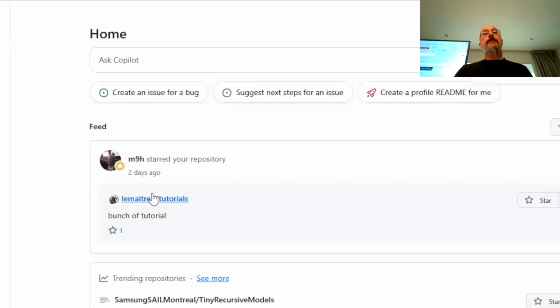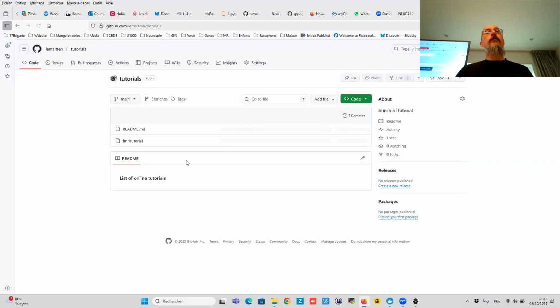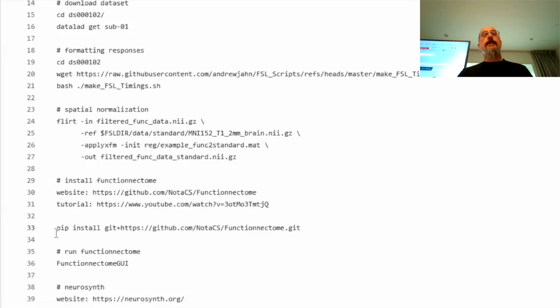Okay. So if you don't have it installed, just to remind you of the command line, there are two lines to run. The first one is the pip install.